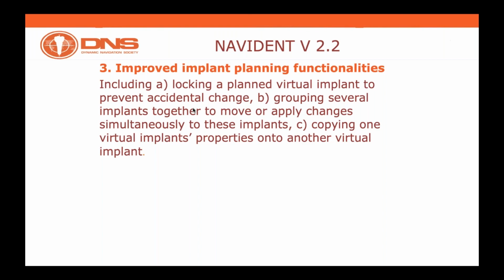We will be talking about grouping several implants together to move or apply changes simultaneously to those implants, and then also copying one virtual implant property into another virtual implant. So we're going to have a chance to really dig a bit further into that element as well.